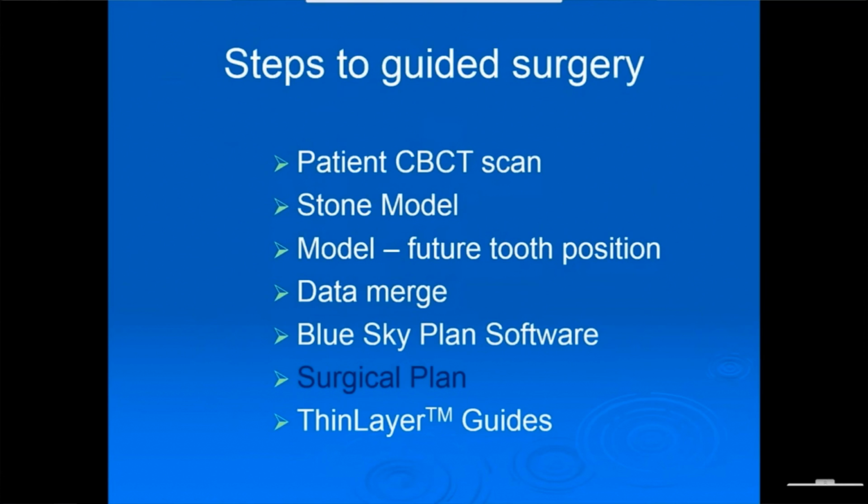The steps to guided surgery may be familiar to some of you, but I'll review it. A patient cone beam scan, a stone model, a model or models indicating future tooth position, and this is what we'll discuss tonight, merging of the data into the Blue Sky Plan software, and then executing a proper surgical plan, and finally manufacture of the ThinLayer guides.